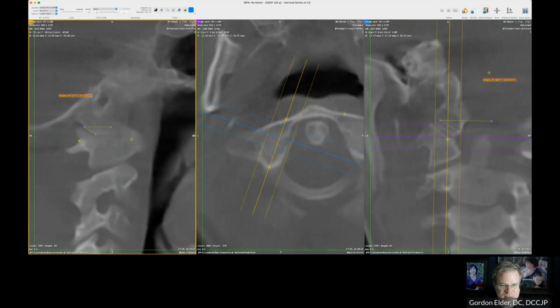And why aren't we measuring the convexity in radians or something like that? We really just need this to know kind of the overall shape of the joint. So we're taking the posterior 1/3 of the joint. So here's the anterior 1/3, middle 1/3, posterior 1/3, drawing a straight line, and we're measuring that. And that's what we need. If we needed to be more accurate, as we think about how the bone moves and how much it's going to roll up when it goes anterior, then we would need to be a little bit more careful with that.